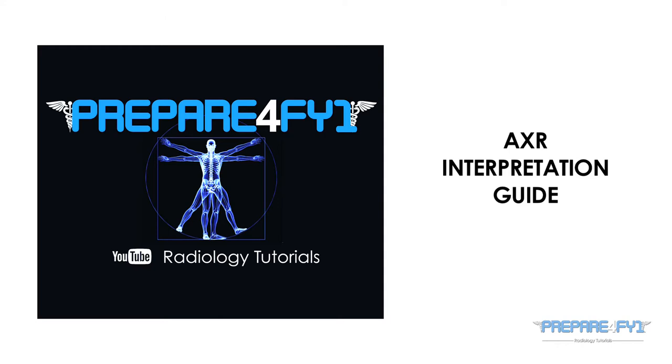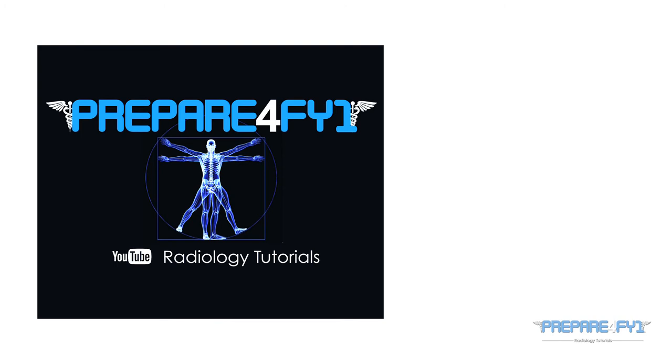This is a short tutorial demonstrating how to interpret an abdominal radiograph using a simple system. Specific pathologies will be covered in separate videos. We are going to use an A, B squared, D, O approach. A stands for adequacy, B squared stands for bowel and bone, D stands for definitive landmarks, and O represents other.